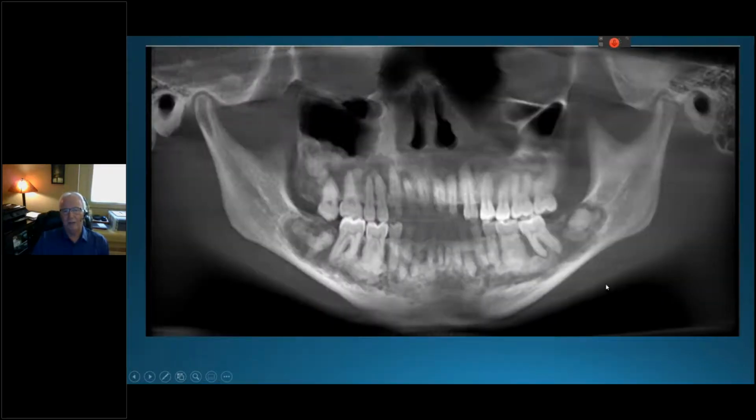This is the reconstructed pan from this case. Now it's looking much more, quote, florid, where you see these big radiopaque areas. So again, you just need to watch this. The other entities that would be considered when you see something this large, and again, you can't consider this common. Florid osseous dysplasia is not rare, but it's not common. But things like Gardner syndrome, things like Paget's disease, those are much rarer. Paget's could be included here. Gardner's could not. Gardner's normally have extra-osseous radiopacities, and I'll show you that in a second.